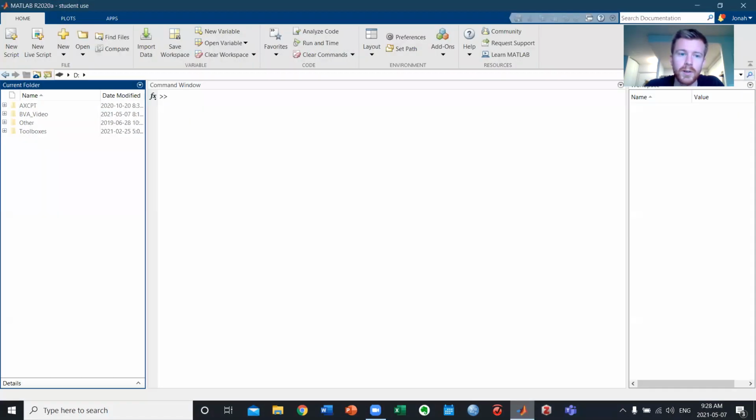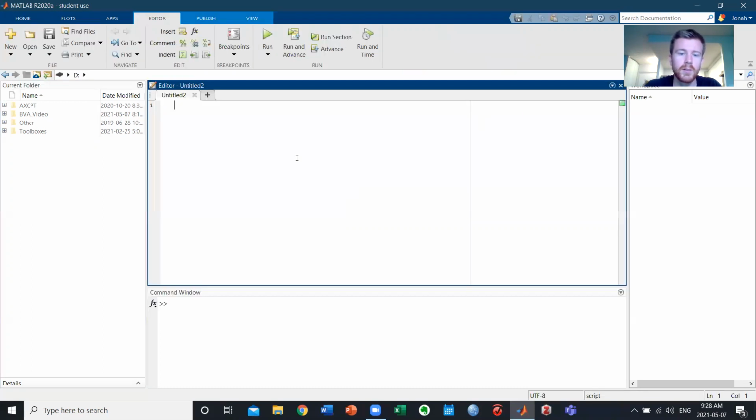So I'm going to go ahead and open up Matlab. I'm assuming that you have some familiarity with Matlab here, as in what these different spots in the workspace are referring to. So your variables, your command window, all those good things. If not, you might want to go ahead and check out some YouTube videos, or Matlab has some good on-ramps where you can learn these things.